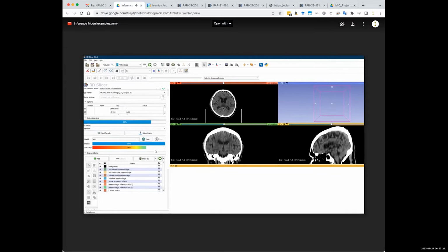The concept is that the MONAI label server app will be labeling all scans as they are sent to it from our PAC system, and it will be identifying all lesions, not just the hemorrhagic lesions that I'm showing you today. But I haven't actually begun training most of these different lesions yet at this point, as that's a much more complex task.